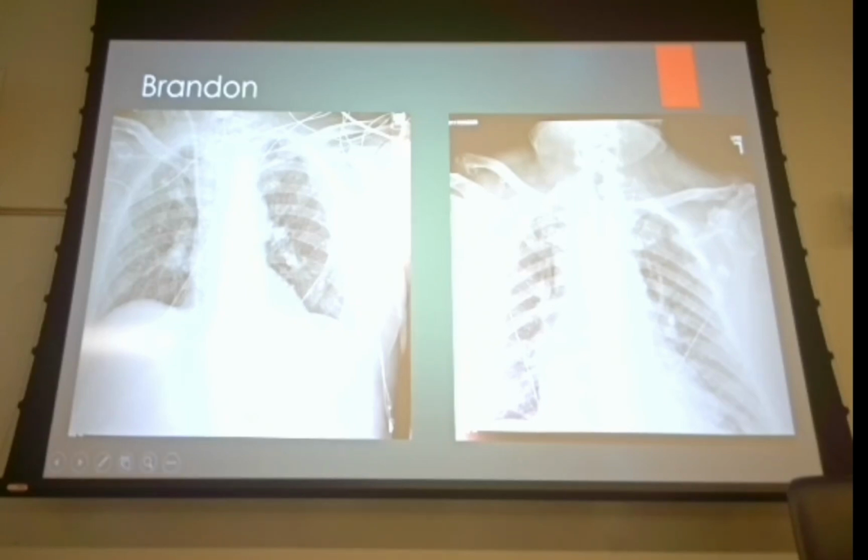If this is for chest tube placement, in a lot of cases that is to see if the lung is reinflated on the side where they placed the chest tube. So is this lung up? Is it reinflated? Answer is yeah. Or sometimes it may be follow-up from pleural effusion. Does it look like the pleural effusion is drained, if that's what it was for? Answer is yes.